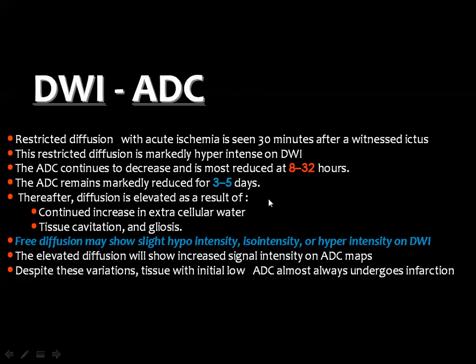as a result of increase in the extracellular water and the tissue cavitation and the gliosis, meaning that after about 3 to 5 or up to 10 days, you get some change in the infarction from the acute phase to the subacute and the chronic phase.